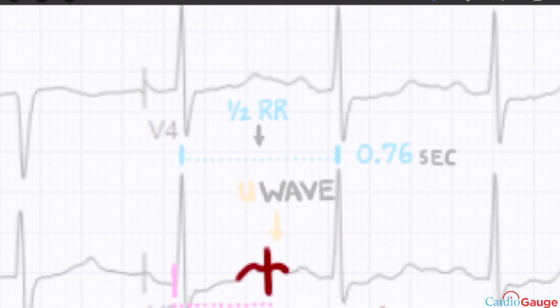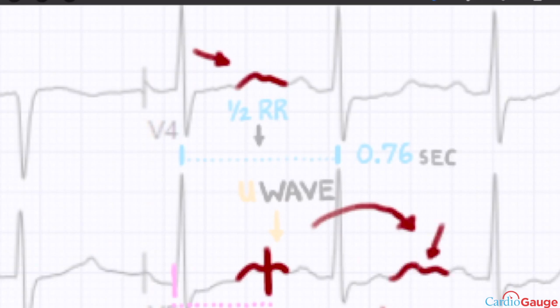Because it comes up a fair bit, you can see here where there's a U wave and it's attached to the T wave, and it's kind of hard to tell where the U wave starts, where the T wave ends, but that's generally how I do it. And here, you can take a look at this one here. T wave, U wave, nadir. This would be the QT interval here. So in this example, as we discussed in level 2, that was 480 milliseconds.